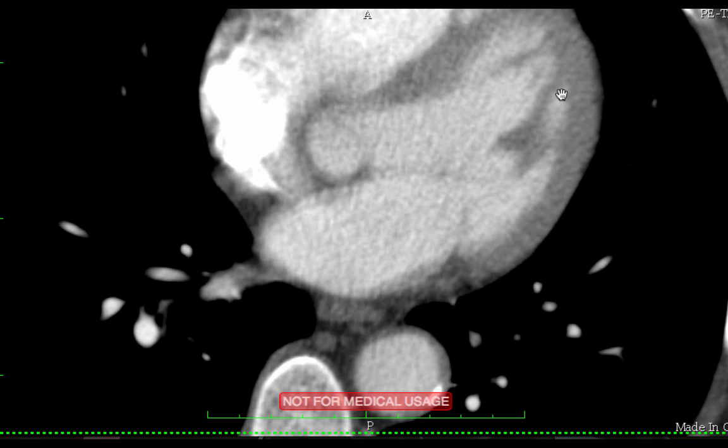But here you have the papillary muscles in the left ventricle, and they are connected by little threads, little chordae tendineae, to the margins of the mitral valve. And so these papillary muscles and string complex, the chordae tendineae are the strings and the papillary muscles are muscles. The muscles contract and thereby equilibrate the amount of shortening necessary to keep these valve leaflets from inverting.